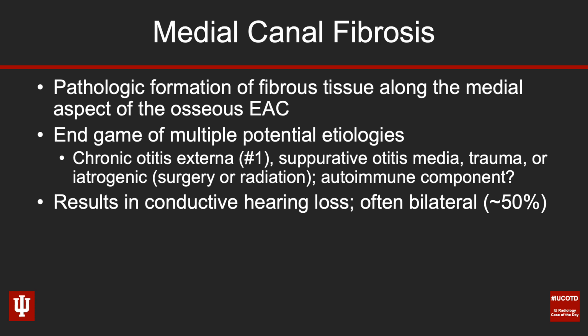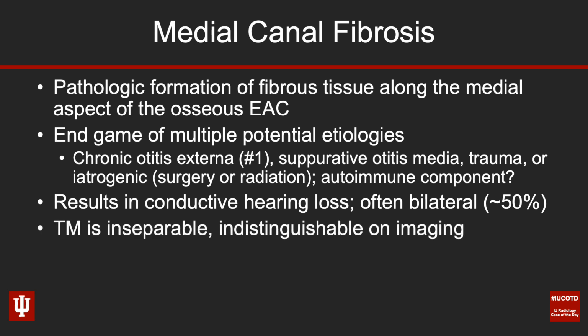It's dampening that conduction of sound across the tympanic membrane. We can no longer use the tympanic membrane and the ossicular chain as a transducer. And again, I want to stress that on imaging, we don't really see the tympanic membrane because this is right up against it. In fact, it's indistinguishable on imaging. So you can see that close approximation to the tympanic membrane, and it makes sense that this is going to impair the conduction of sound.